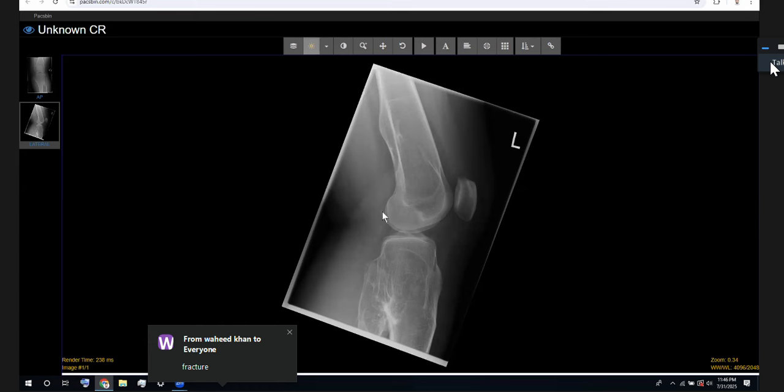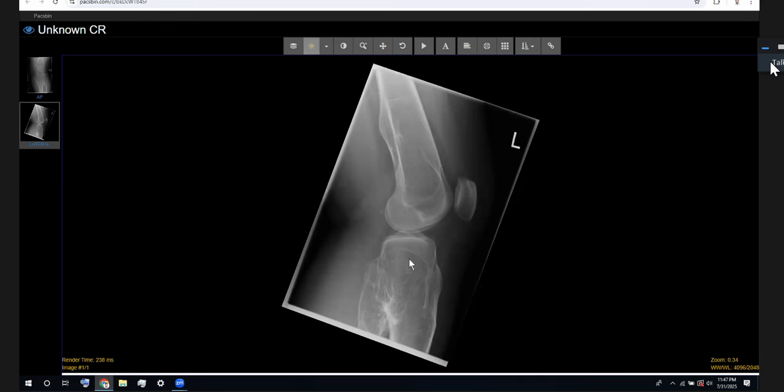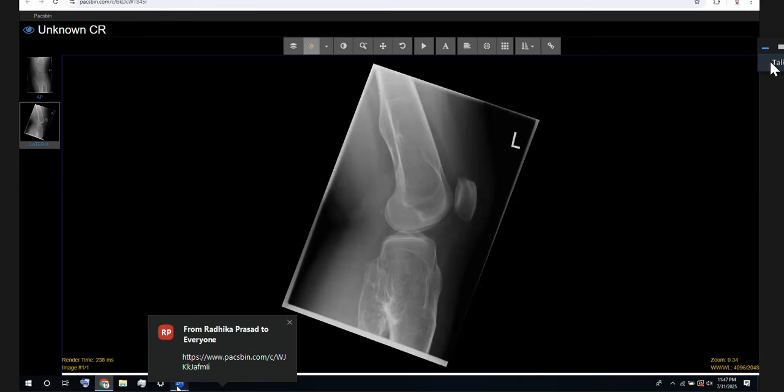So this is diaphyseal aclasis, or hereditary exostosis, whichever you want to call it. And it's just like an exam favorite. They like this condition because I suppose it's quite interesting and there's a lot to talk about. So happy to take any questions as we go. Otherwise, we'll move on to the next case.